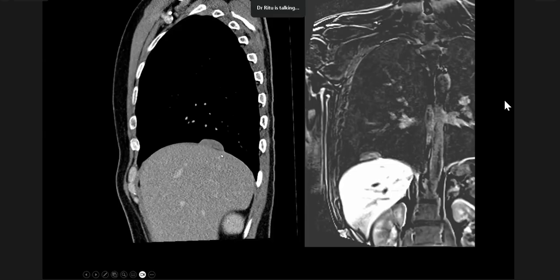Here's a patient who was having CTs for melanoma surveillance, and they found that there was a pleural-based lesion, which was stable, but initially thought to be maybe a pleural-based metastasis from his melanoma. It wasn't really changing over time, and you can see that it's very broad-based to the diaphragmatic surface of the pleura.